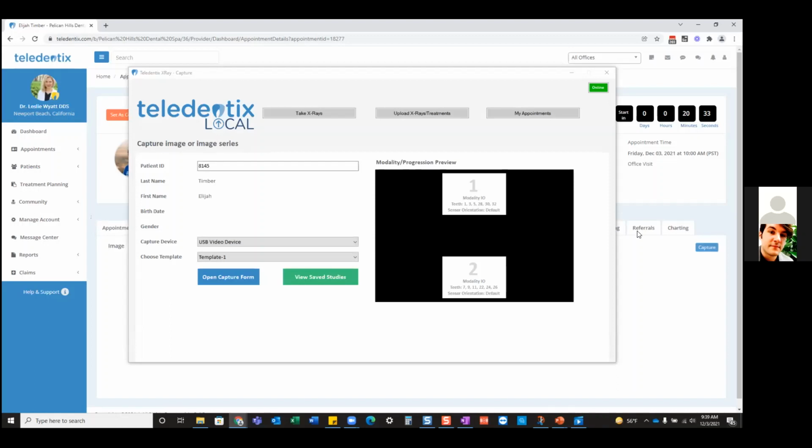Now you can see that I am online at the moment. One of the things that has changed since our last update for Teledentix Capture is this screen right here, which you do not want to get rid of. We'll walk through that in just a second.